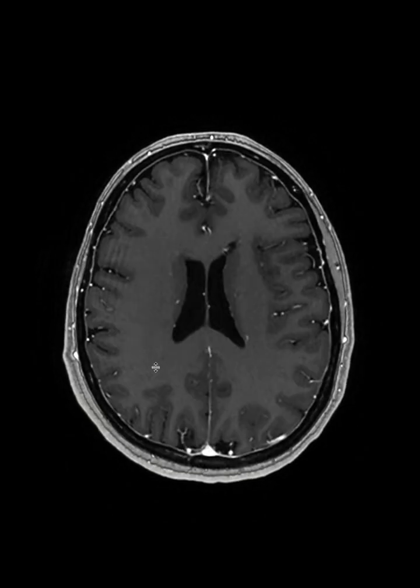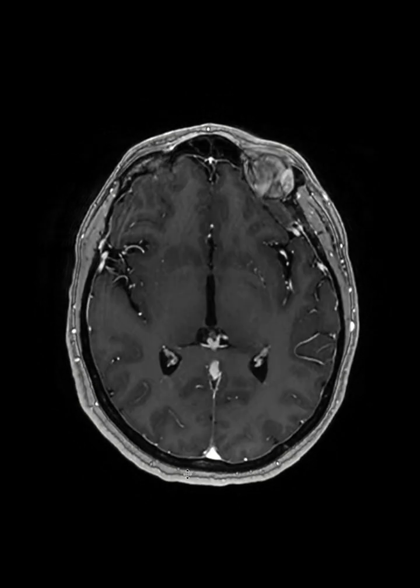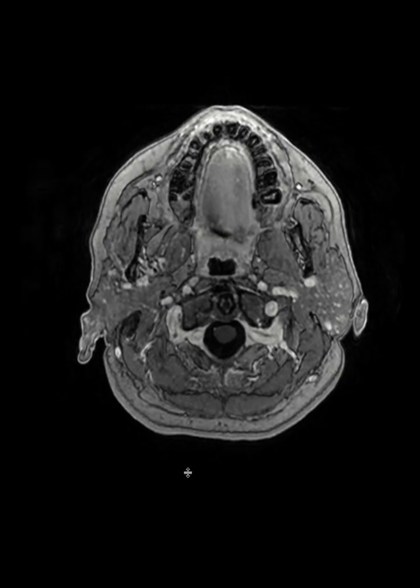And although the central vein sign is not really assessed on the post-contrast, you see that there are some central veins here in these lesions as well. Okay, so it shows that these lesions are not contrast enhancing. So this is another feature that these lesions are not active, and it happened in the past. So very classic imaging features for multiple sclerosis.